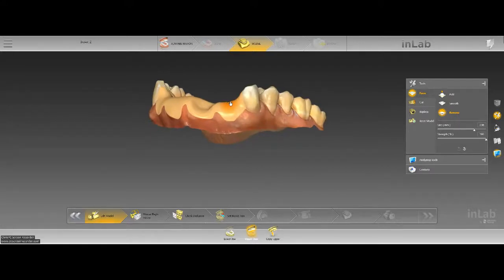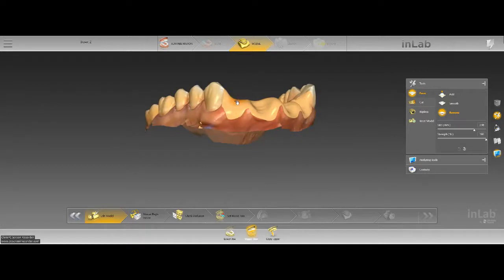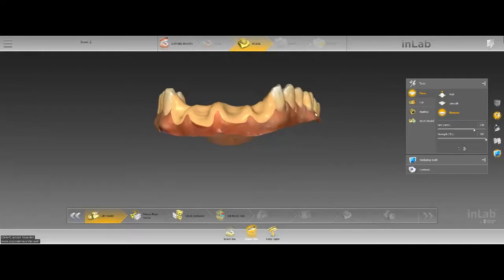Same thing here. The only thing we're using this model for is to actually develop our digital pontic. We're actually going to be using the bio copy for our overall design. So we'll give this another opportunity to create our space. All right, overall, I like that basic design.